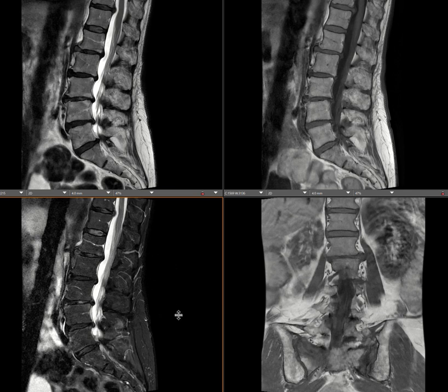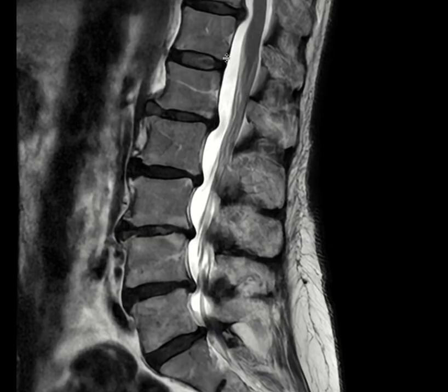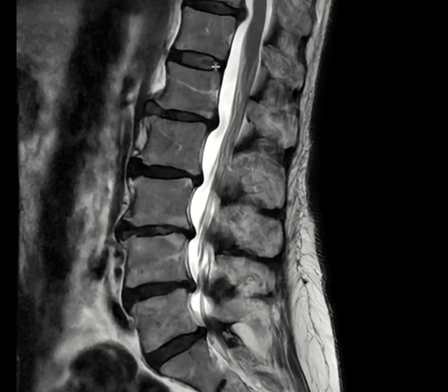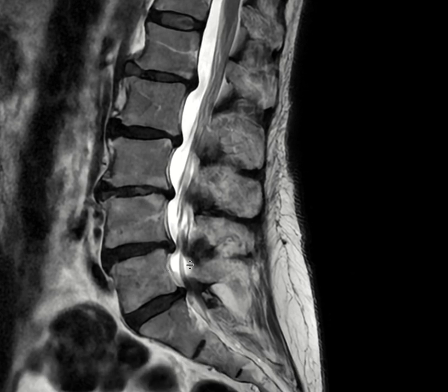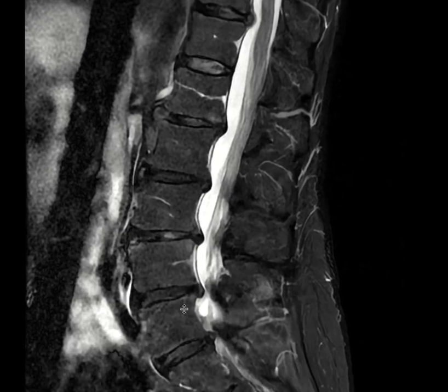So imagine this patient is a 70-year-old female coming with back pain. We usually do our regular search pattern. We don't see anything obvious. If I do a very quick search through the lumbar spine MRI, I don't see much going on. There are some disc bulges here and there, but they are not compressing the spinal cord that much. I don't see any high-grade spinal canal stenosis. There are some degenerative changes, but nothing is horrible. There is no acute fracture as far as I can tell on this T2. And if I look at the STIR sequence, there is no acute fracture in the lumbar spine.